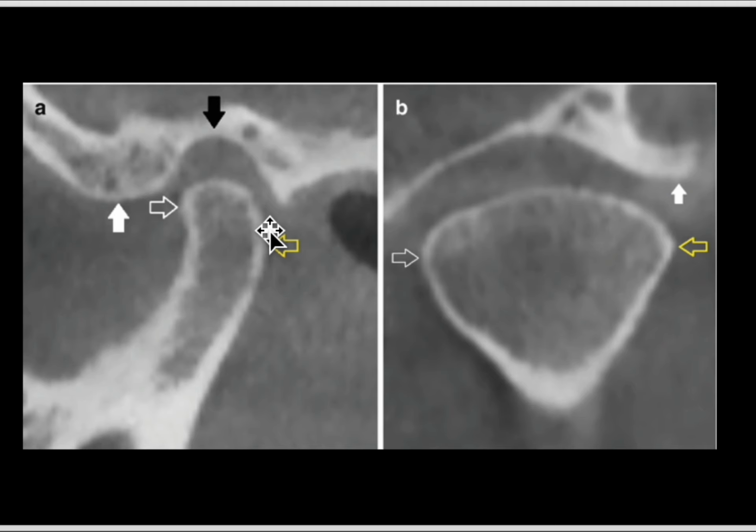The cortical thickening is actually just a protective mechanism of the condyle, or a response to the increased biomechanical loading. The trabecular pattern here of the condyle should be uniform with no areas of sclerosis or low density. If you see any low density area, then this might indicate abnormality.